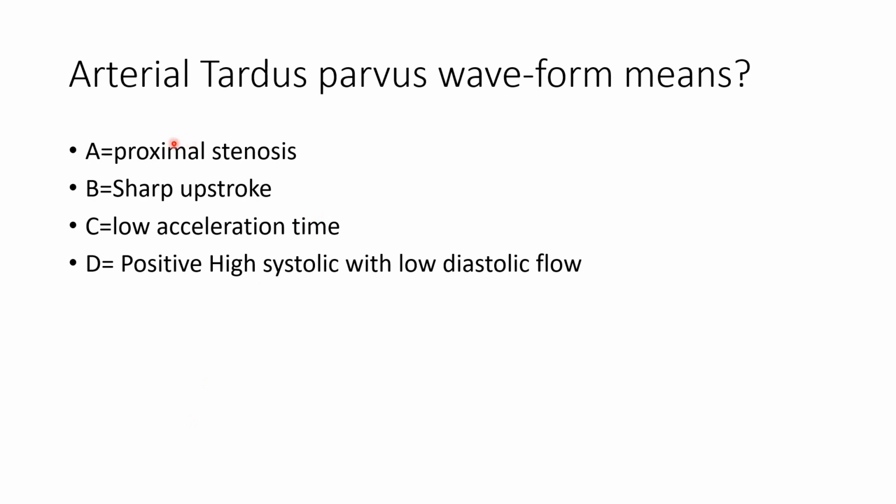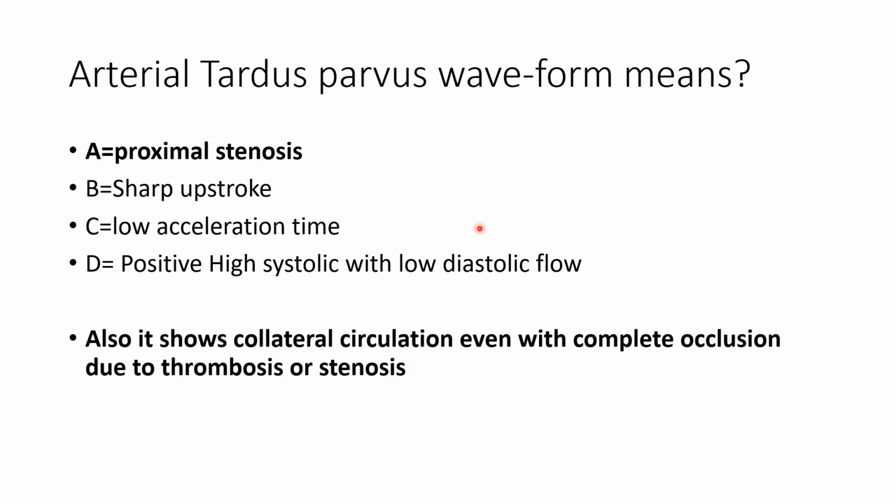This question: arterial tardus parvus waveform means proximal stenosis. Why do we speak all the time about tardus parvus waveform?